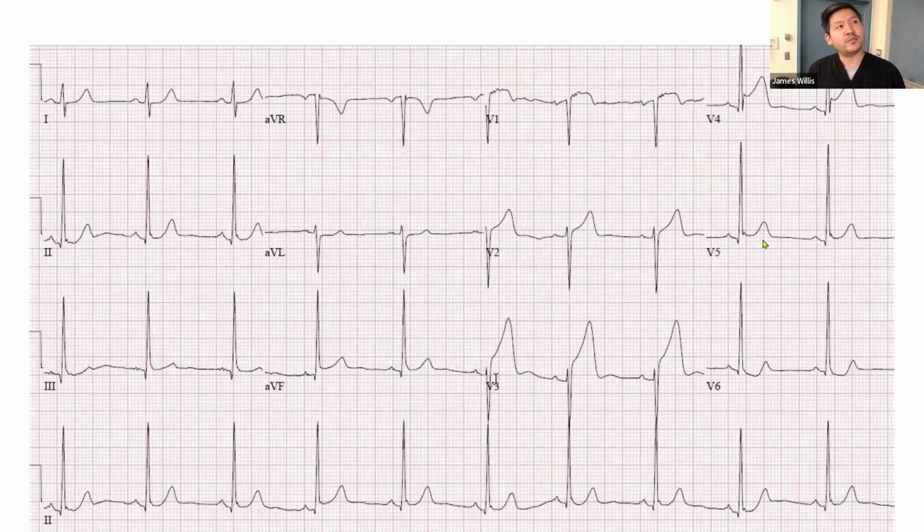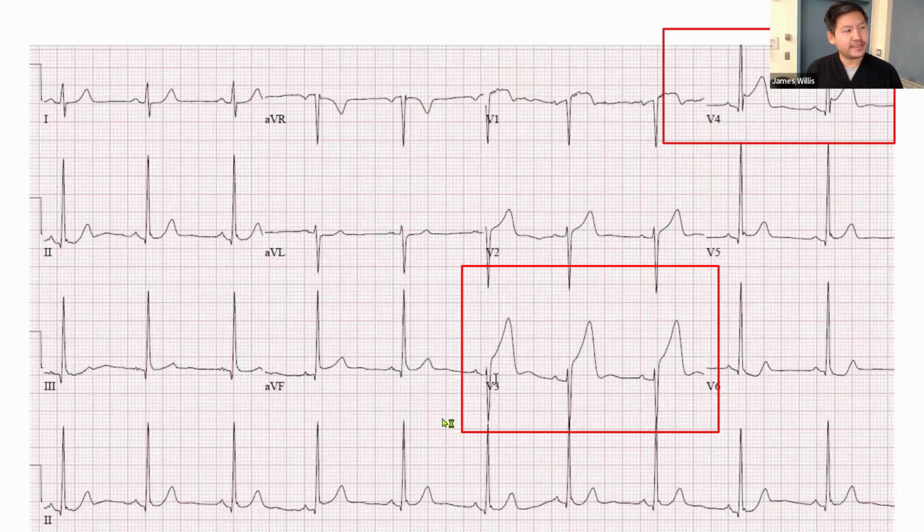But if you notice the morphology, this is a fishhook. You have this terminal positive end of the QRS, but there's none here actually. This is also called, you know what this is called? This is QRS distortion, terminal QRS distortion. So this is a very difficult EKG because you have LVH and early repol. It's just a nightmare to diagnose an OMI, but this patient had an LAD occlusion. I think you guys kind of see a pattern here.